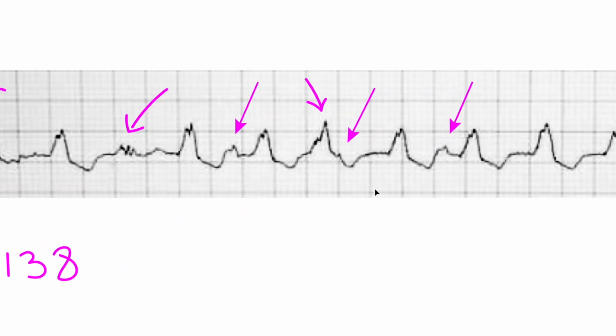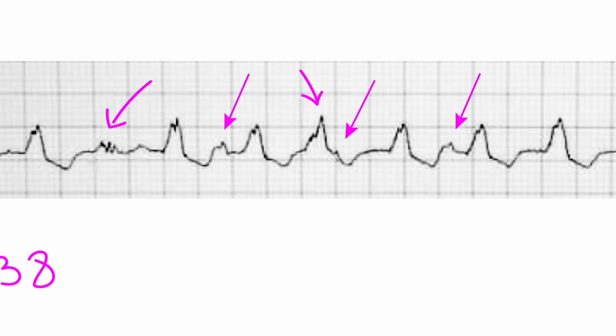So I'm going to take a look at this. I'm going to zoom in here, and I'm going to make an assumption that this indeed is a P wave or just atrial activity. And then over here we have another one, and over here we have another one. Now I'm going to measure the distance between these two. This looks identical. So here we have 5, 10, 15, 16, 17, roughly 17 small boxes. Same thing over here, 5, 10, 15, 17. So this activity seems to be consistent.